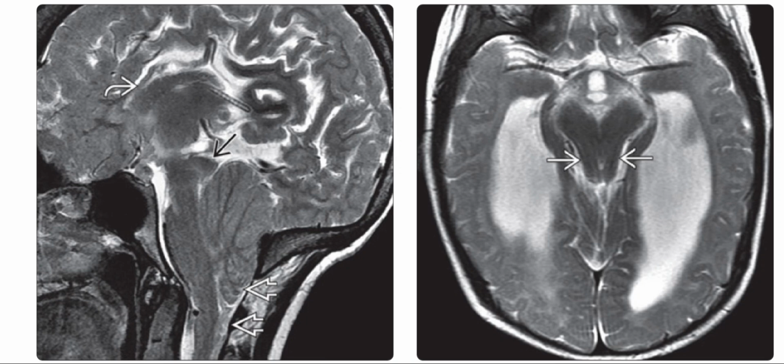The left image is a sagittal T2 weighted MRI of the brain. It shows characteristic Chiari-2 findings with the very small posterior fossa size, prominent tectal beak, and vermian tonsillar extension through the foramen magnum. The corpus callosum is severely dysplastic, and the ventricles are small following the CSF shunting. The right image shows the axial T2 weighted MRI sequence, and it depicts the enlargement of the occipital horns of the lateral ventricles, which is called colpocephaly, related to the callosal dysgenesis in conjunction with the beaked tectum.